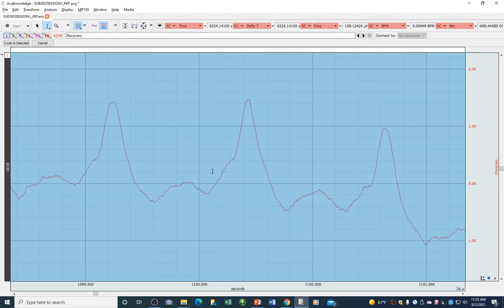So there are some things to consider here. Here looks like a possible notch that we're going for in this one. And here's a possible notch here. That's a big old notch. And here's a harder to find notch. I think in this case I'm going to take the one that's a little harder to find, because the more clearly I define that in this step, the more information the algorithm will have to work with.